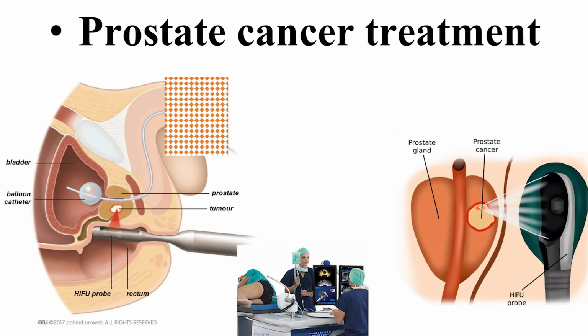Okay, before starting the simulation, I provide some application of HIFU. For example, prostate cancer treatment. Here you can see a HIFU probe that is inserted into the body, and the HIFU signal reaches the prostate tumor region, and the treatment will be done.